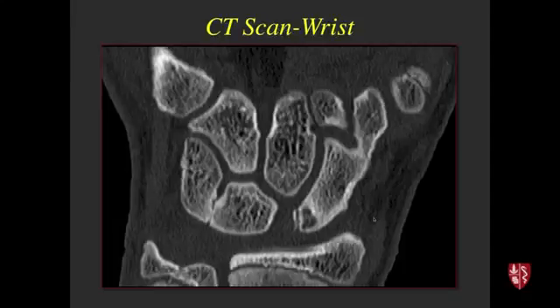So for things like the wrist, it can be advantageous to obtain the data in a transverse plane, perpendicular to the wrist bones, but then we stack those up and reformat them so that you can see the relevant anatomy. So in this example, this space is really widened. And the patient's a pediatric patient. You can see the physes are still open here.